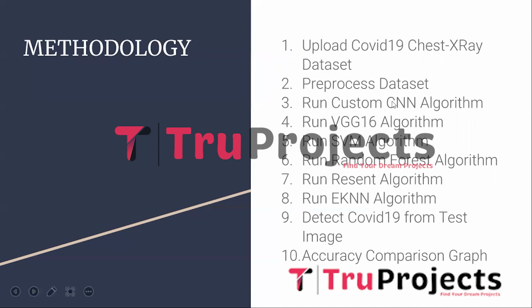And the third module is Run Custom CNN Algorithm. This module involves the implementation and execution of the custom CNN algorithm. The pre-processed images are fed as input to the CNN model, which then applies various CNN layers to extract important features from the dataset. The model is then trained using the extracted features. Once trained, this model can be used to predict whether the test image contains the signs of COVID-19.